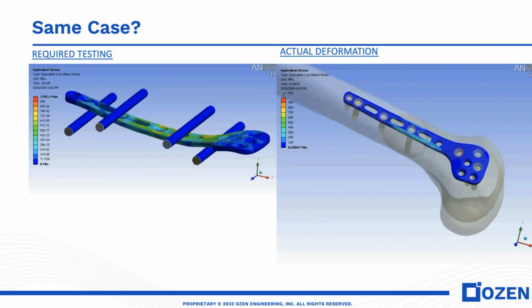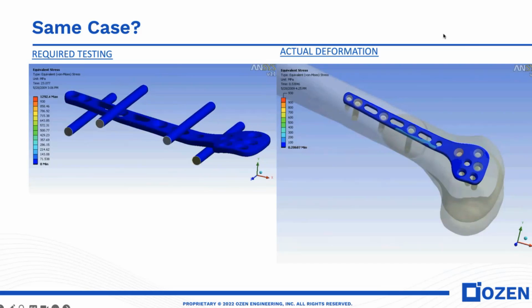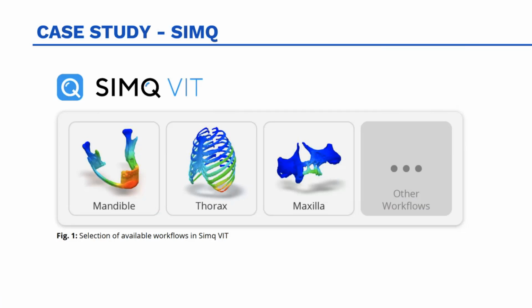In the old times, to pass with an implant design, you had to pass this type of a test, but through this procedure, you can actually get more realistic feedback about your design.